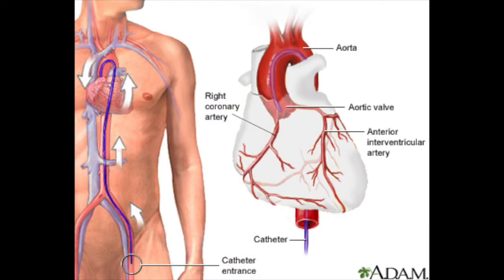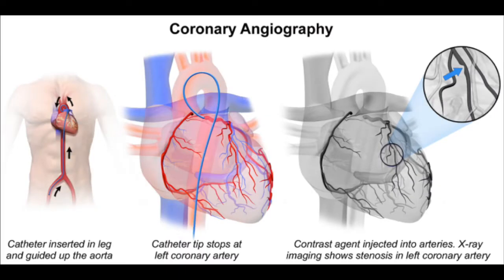Coronary angiography is the gold standard for visualizing coronary anatomy in the clinical setting. To visualize coronary vessels with angiography, a catheter is often inserted into the patient's femoral artery in the groin. The catheter is then advanced through the arterial system until it reaches the coronary ostia, which are the openings of the coronary vessels. Once the catheter is positioned, a contrast dye is deposited into a coronary artery. An X-ray source and image intensifier are then used to visualize the heart's arteries.